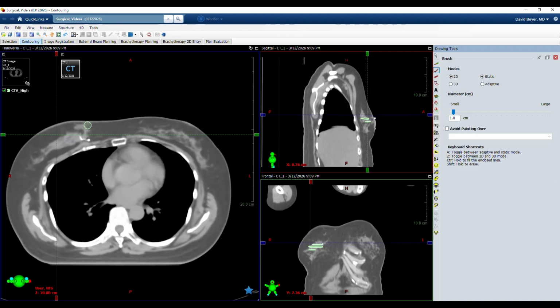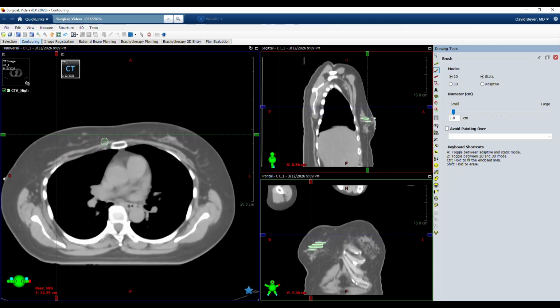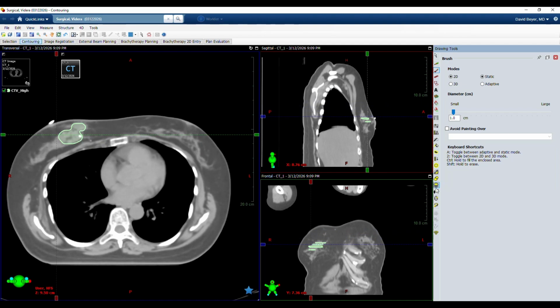And oh, there's a couple more clips that are kind of out here. And again, where do I draw the line? Do I stop it here? Do I come all the way here? I really don't know. Is this still tumor bed? I think so. I'm not sure. I'm going to include it. And then we're going to expand that for my planning target volume. But this is essentially what I see as the biggest frustration with breast cancer contouring.